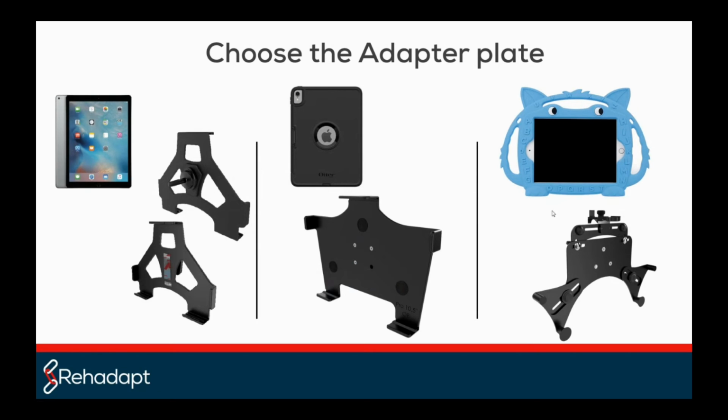So you click it inside. It's often easier when it is installed to the wheelchair. So now the communication system is secured inside, and you can install it with these adapter plates within a second to the customer's wheelchair. But also with a different kind of other adapter plates, with these strings, for example, you can also secure very easy all different kind of other tablets or notebooks in combination with the mounting systems.